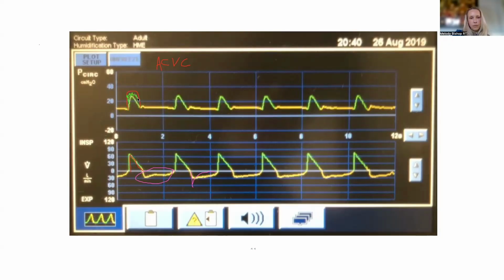The green is all this pressure that's missing that should be there, right? In my mind, if it's pressure that's missing that should be there to be driving the volume, that means that someone else has to be providing the pressure, and that person is the patient. So the patient is breathing, as you mentioned, pretty hard throughout this breath.